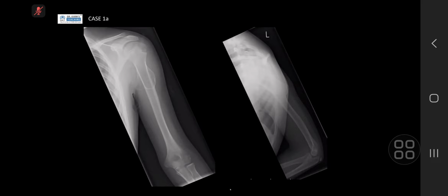Right, so if I could have candidate 1 to have a little go at describing the first case. Okay, this is a frontal radiograph of the left upper limb, humerus, and the left shoulder joint. I see in the proximal left humerus a lucent bony lesion with a well-defined sclerotic margin. In this view, I suggest this is projecting from the bone. It has a narrow zone of transition.